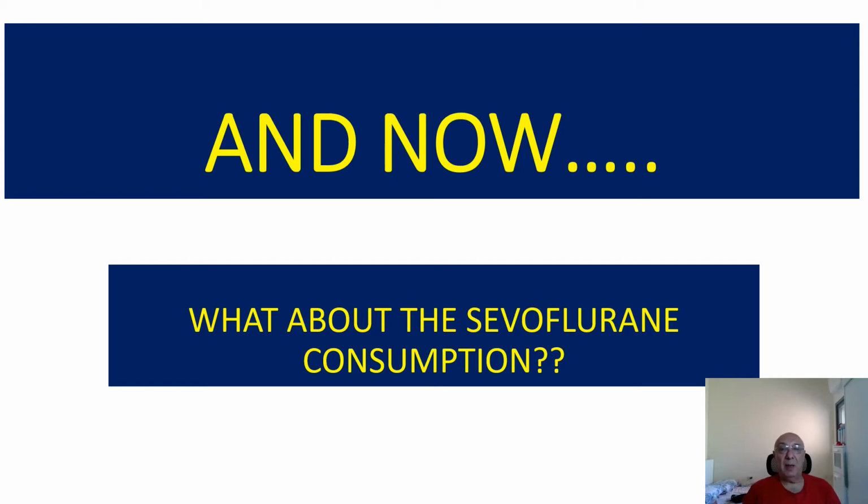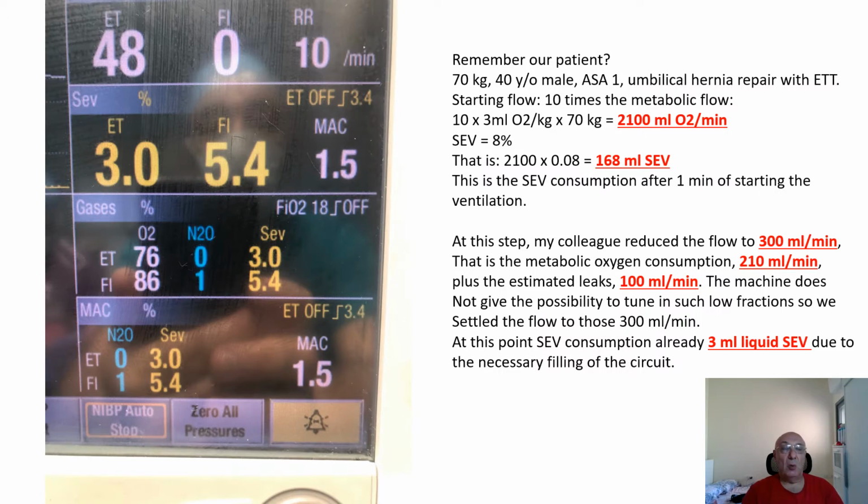Let's see now what happened with the sevoflurane in the same patient we spoke about at the previous meeting with oxygen. 1 minute after the beginning of opening the sevoflurane, this is what we have. I'm trying to highlight it. I hope I'll be able to. 1 minute after that, you see here the calculation.